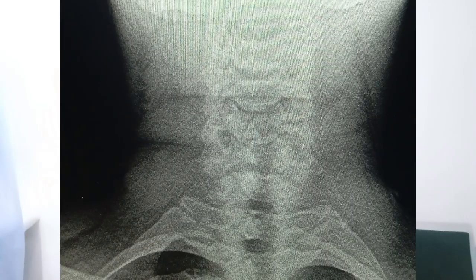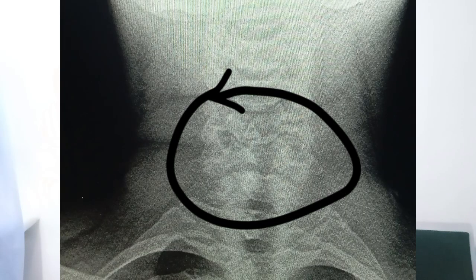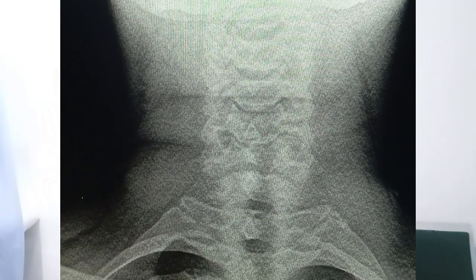But for some other people, there's pain. I'll show you two x-rays of this. Now, the first one, look at that particular circle. It might look very inconsequential because the person does not actually have pain yet. But if the person keeps walking, there's a tendency for the first person to come down with pain. I mentioned a video of someone who has been walking but doesn't feel pain. But we had to give him a modality that will help distract the neck so that there's no pressure coming down on the cervical region.